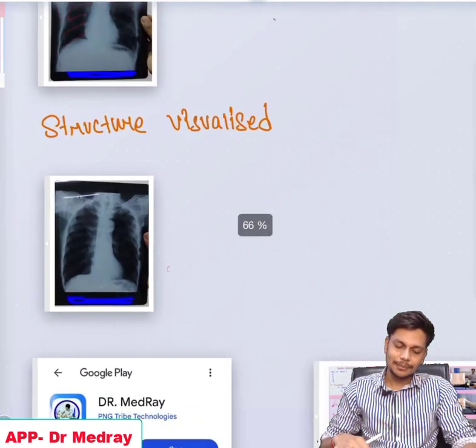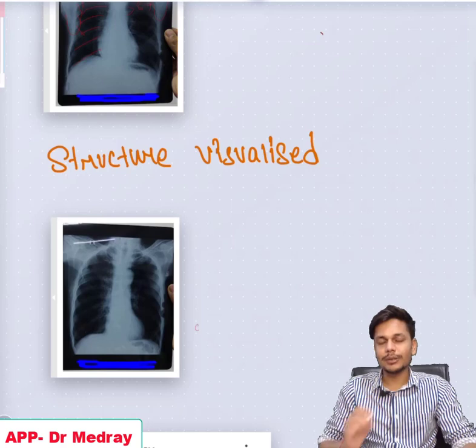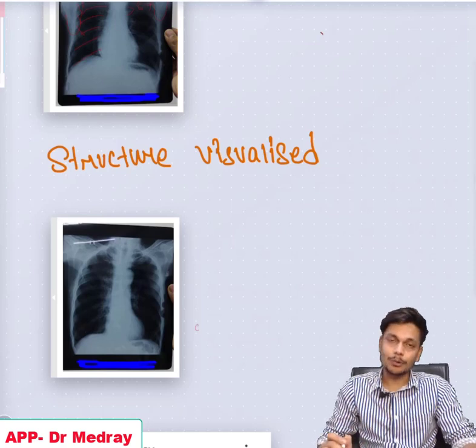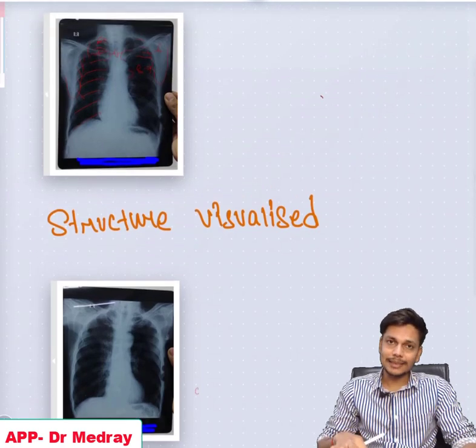So most of the time, if you are not understanding the pathology of the lung, but your approach is good, that you are commenting about the view, the exposure, the position, then you are going to pass, if you are an undergraduate student. So the approach is important.